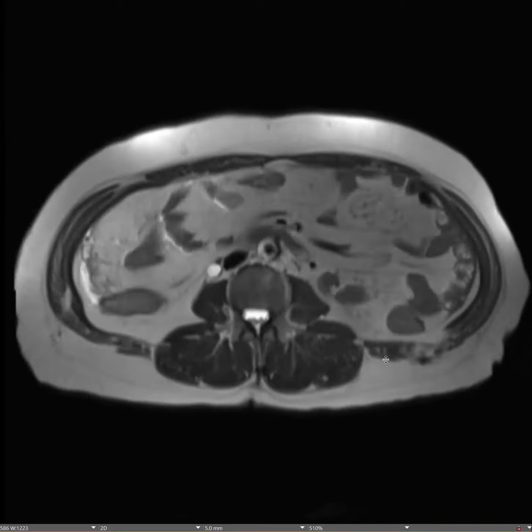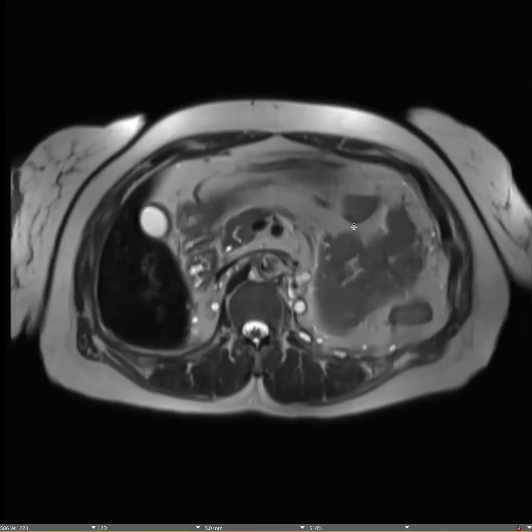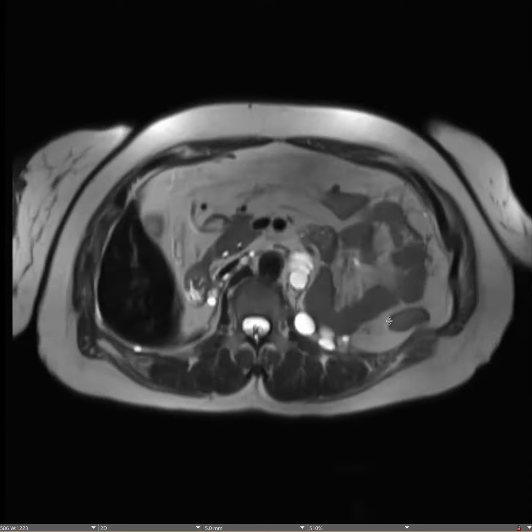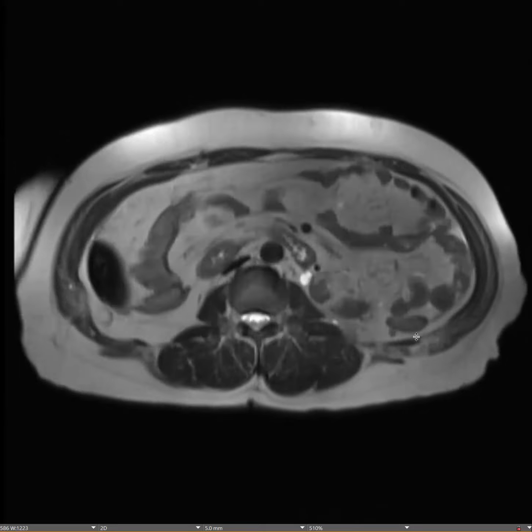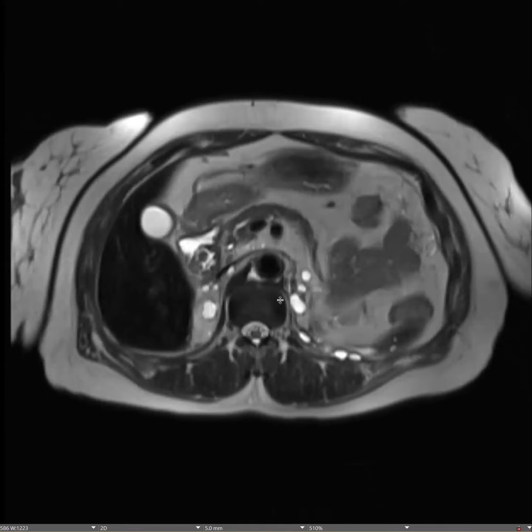Is it some kind of treatment related, like immune therapy? No, he was not on immunotherapy. We checked all those. So we were wondering if it could be from, and his distribution was kind of more retroperitoneum compared to the others. We were wondering if this patient had any kind of lymphatic obstruction.